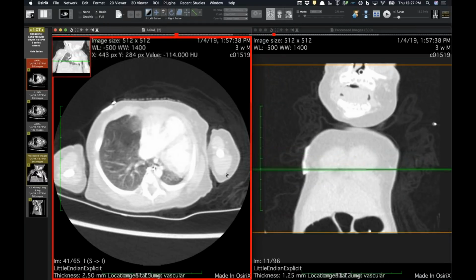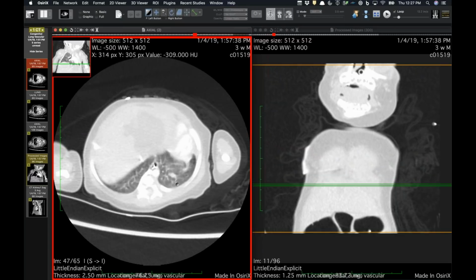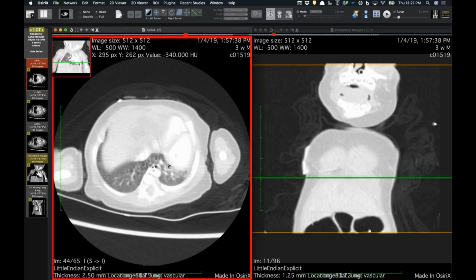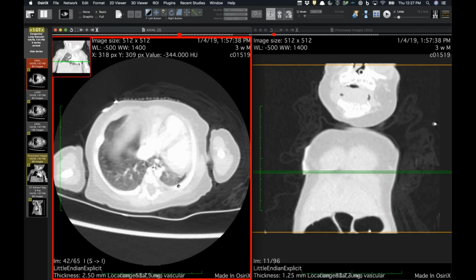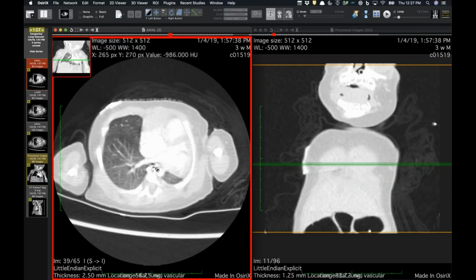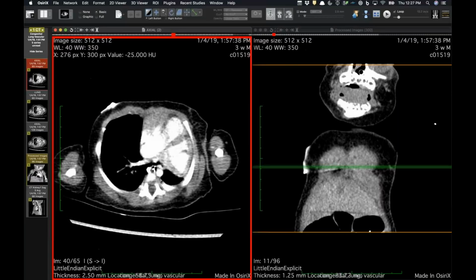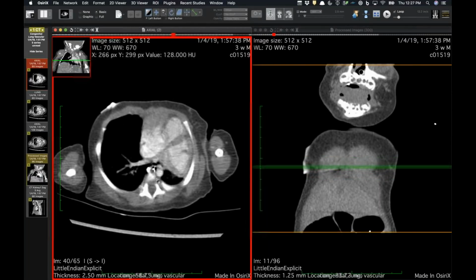Now, the one other question for everyone, and I know we've discussed this before and shown actual cases of horseshoe lung where you have fusion of the basal segments of the lower lobes. I like to call this a horseshoe lung just because it's right lung herniated across to the left, but I guess that's probably not the correct terminology for this case. Would you agree, or would you call it agenesis with horseshoe?